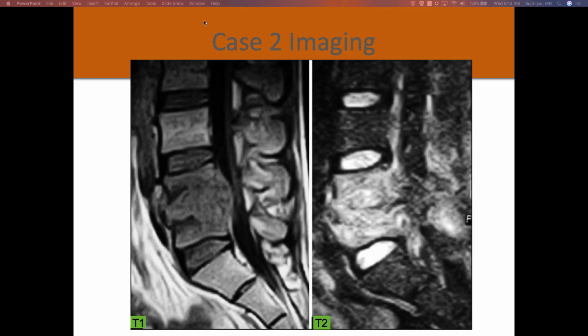When we come to the disc, the vertebral end plates are absent, they're destroyed. And again, when you see involvement of the vertebral end plates, that points toward infection. There's some prevertebral edema as well, extending beyond the vertebral body, and some extending posterior to the vertebral body, so there's some intraspinal extension of this inflammatory process.